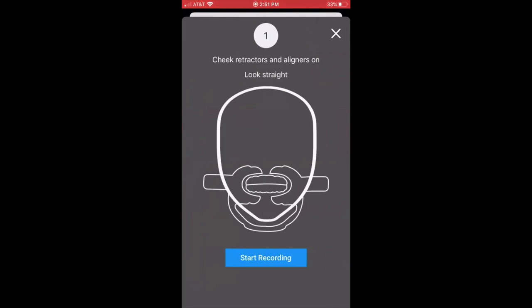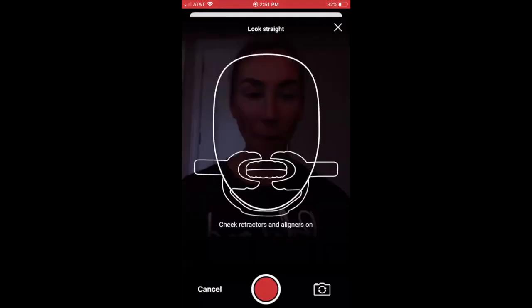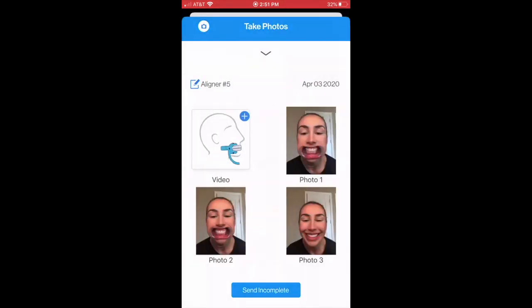Okay, and so the next thing would be the video, but it's not allowing us to do that because we're recording our Zoom. So you can just go ahead and hit send incomplete.